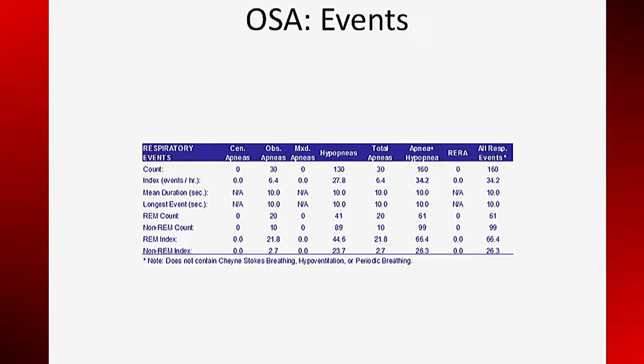Let's attach some numbers to the events. There were 30 obstructive apneas. There were 130 hypopneas. There were 160 total respiratory events.